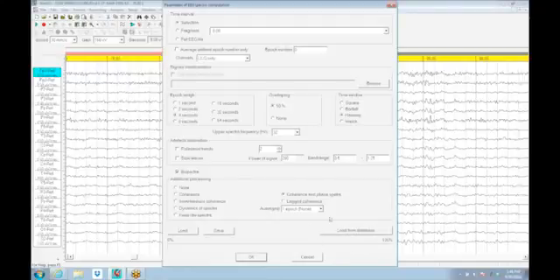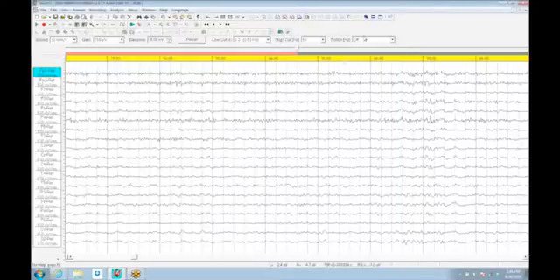There's an expense associated with that at this point, and unless you've got a dongle, this won't be lit up. So that gives you, I think, a real quick run through on some of the simple processing.